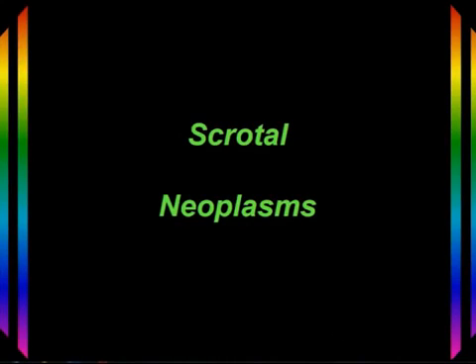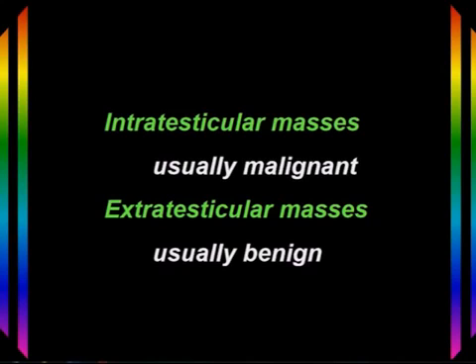One of the most important reasons we do ultrasound of the scrotum is to look for testicular or other scrotal neoplasms. It's important to immediately determine whether a mass in the scrotum is intratesticular, because those masses are typically malignant, or extratesticular, which are usually benign lesions.